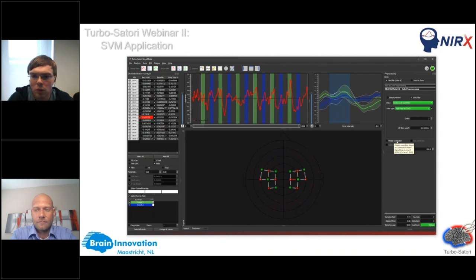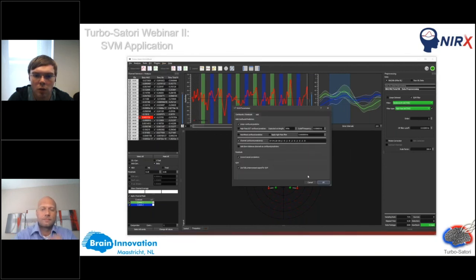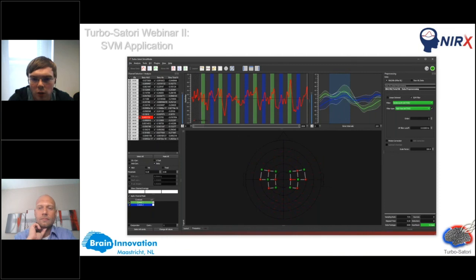Next to that, we have the motion correction, which can be used, and the SSR correction, or adding the short channels within the confound predictors. Currently, we don't check specifically for trials where motion occurs, so we use the filters and settings within here. But there is a plan to also integrate a real-time check for specific motion and then exclude this. So adding predictors that are really detecting motion so that they explain the motion and can be used in the GLM filter to clean it.